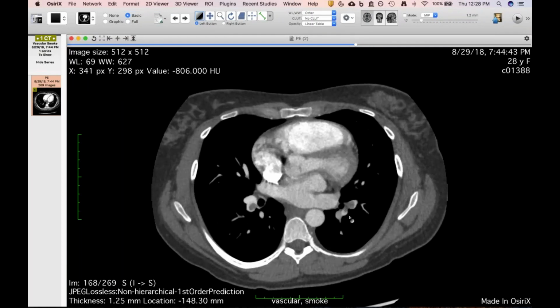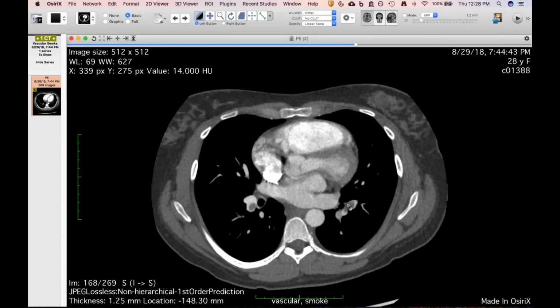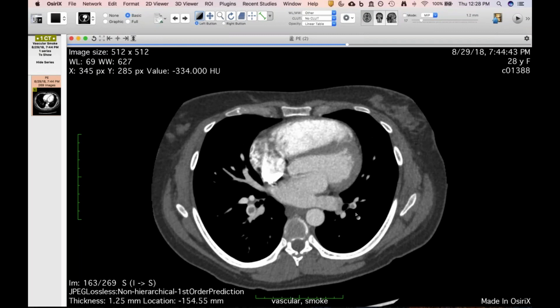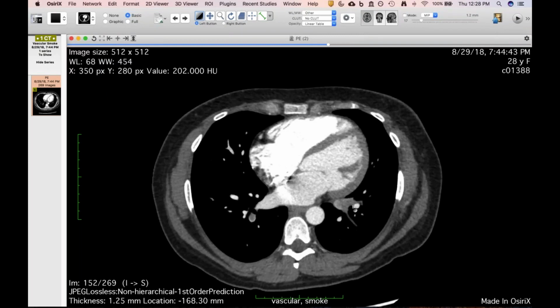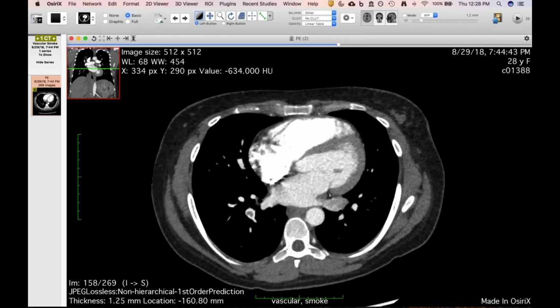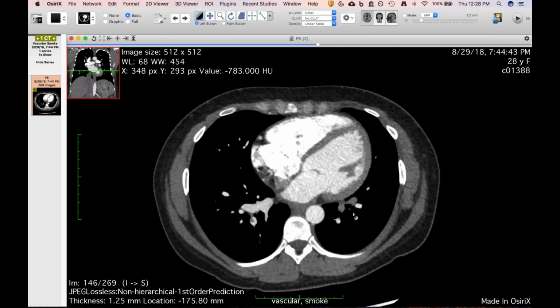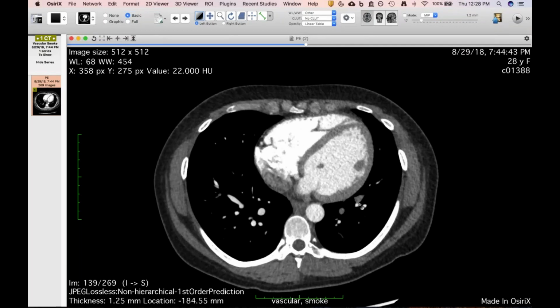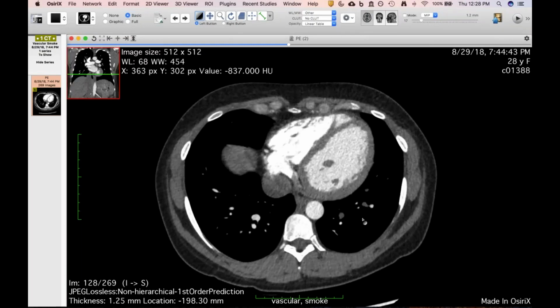But what's really interesting about this, and it wasn't recognized at first overnight, is that pulmonary emboli go into the left lower lobe basilar segments, but then those vessels are opacified distally. But look at the left inferior pulmonary vein, it looks like there's more ill-defined smoke-type filling here. But as you get further distally into these pulmonary veins, there's no contrast in these.